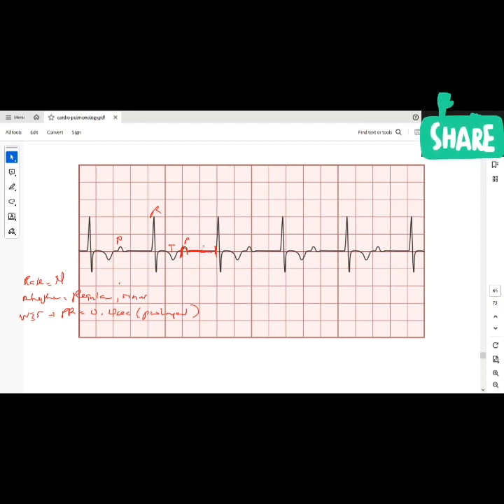So now this patient has a prolonged PR interval. What would be on my mind in this person? It's longer than it should be. What should I be thinking? There's a problem at the AV node. Thank you very much. That's what it means. The AV node is slower than even usual. We know it's very slow, the slowest, but now it's even slower in this person. That's why the PR segment is longer than it should be, and my overall PR interval is prolonged as well. What we call AV node block is most likely going on here. Does this make sense? Yeah.